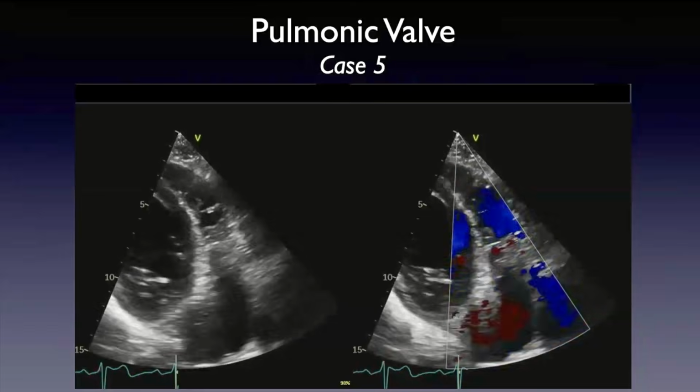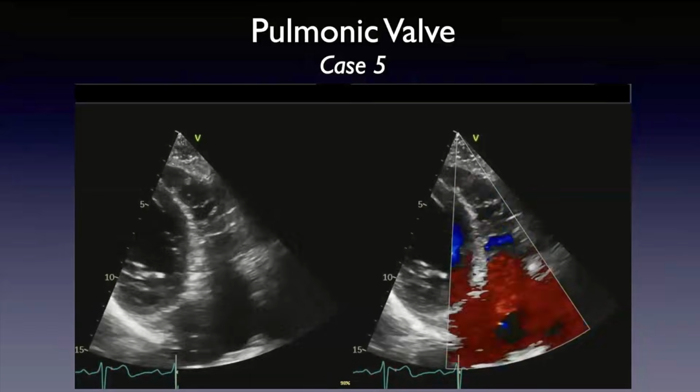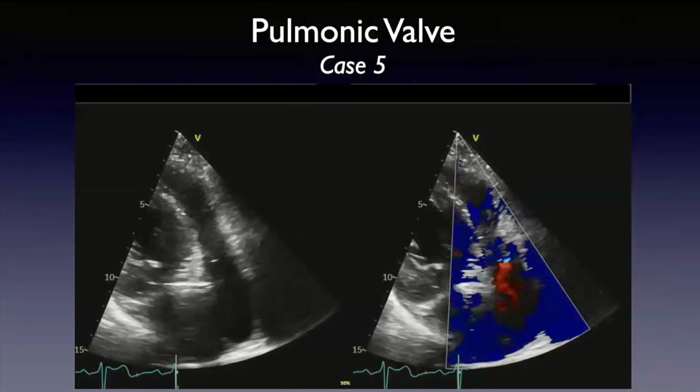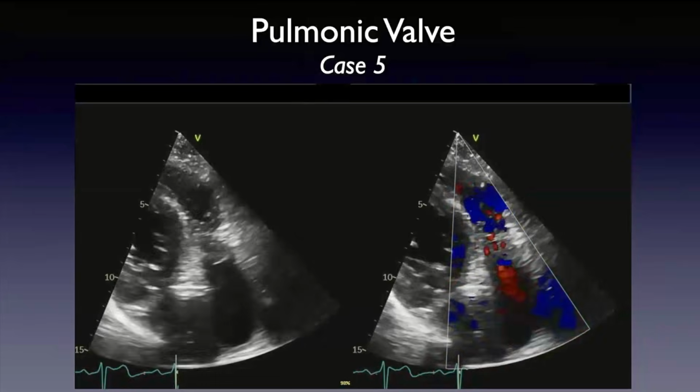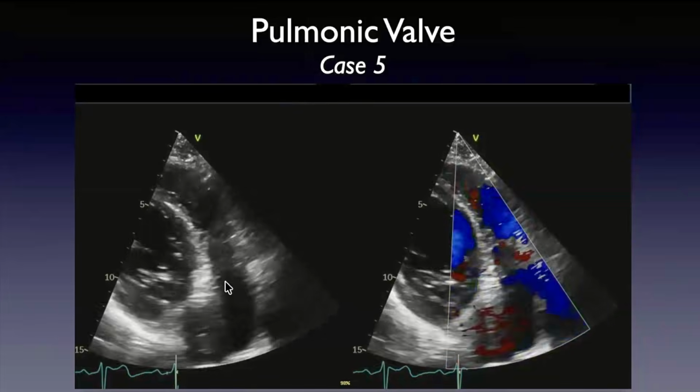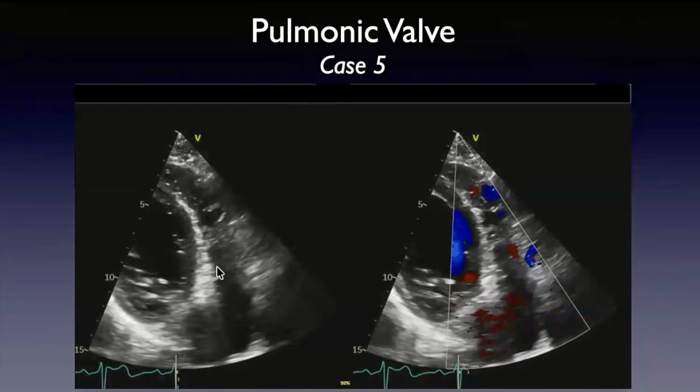What do you think? You really can't see the cusps well. Can you see the cusps? Something just before the branching. I can see that. That's the valve cusp. Yeah, so there's a bit of beat-to-beat variability, but you wonder, see here?